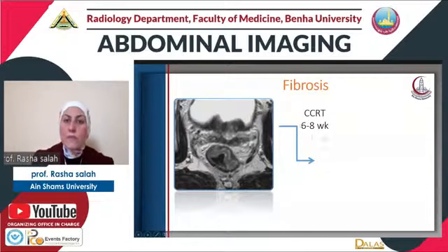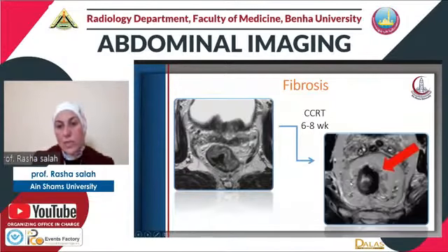So when we perform the assessment after 6 to 8 weeks, this is the initial MRI, and this is the post-treatment MRI after 6 to 8 weeks.